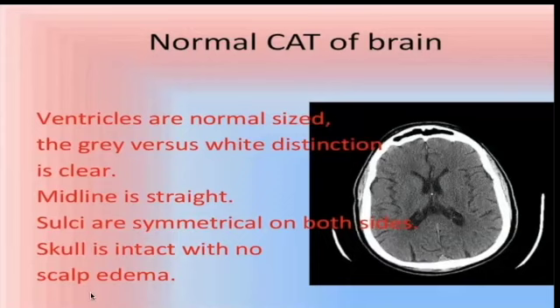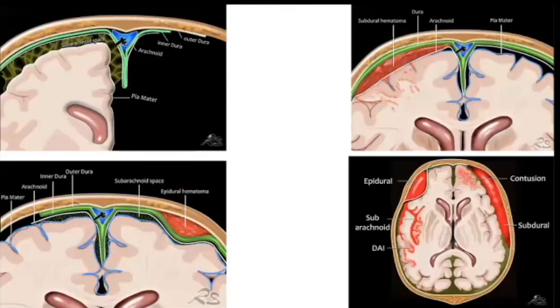What color should I be looking for if I'm looking for scalp edema? Black, perfect. So I'd be looking for a darker color, something in the same shade as this here in the CSF. So it's not as black as the air here, but darker than the rest of the structures like the CSF in this image. Okay. So again, the CT is just a game of colors. You have to know which colors you're looking at. And if you do a fast revision of your anatomy, this shouldn't really trouble you.